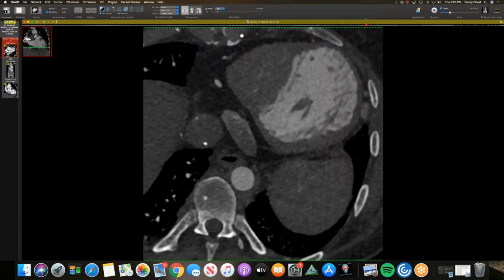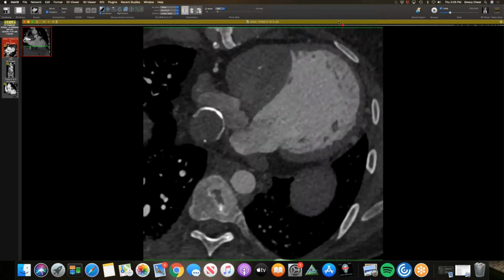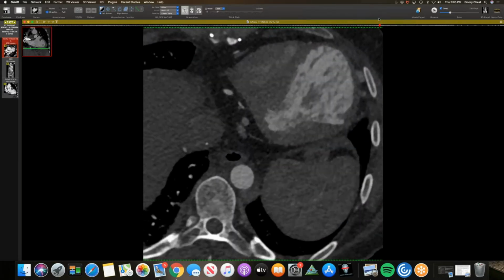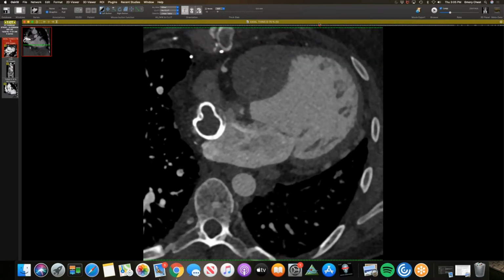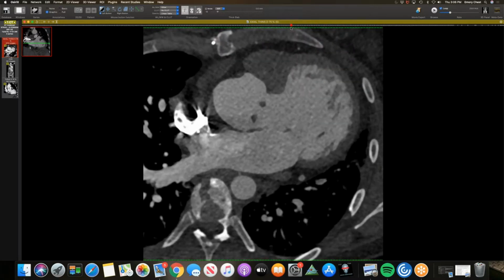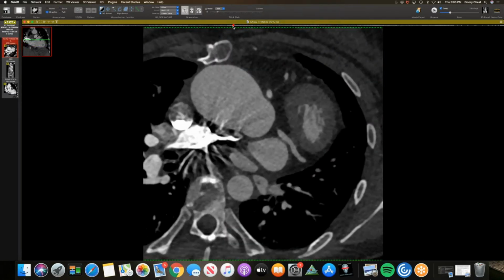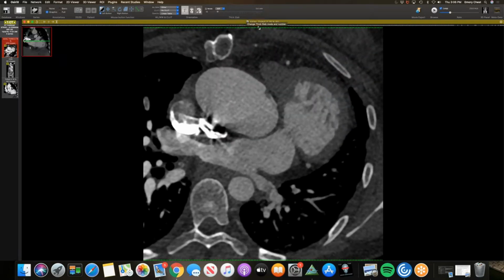It's a good scan showing the lateral tunnel Fontan, and unfortunately we didn't opacify the Fontan very well to look for patency, but there was a recent cardiac MRI which showed it was patent. So just a quick review, you have the IVC here, and as we come up, it goes into a baffle in the right atrium, and it shunts it away from the tricuspid valve, which is atretic. And as you go up more superiorly, you have the superior vena cava communicating with this, which is the right pulmonary artery.